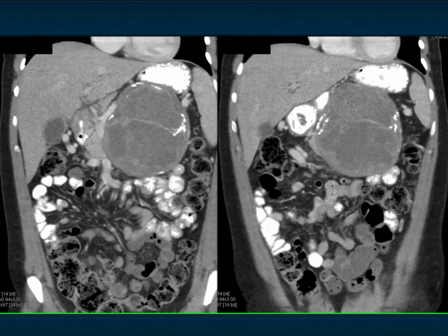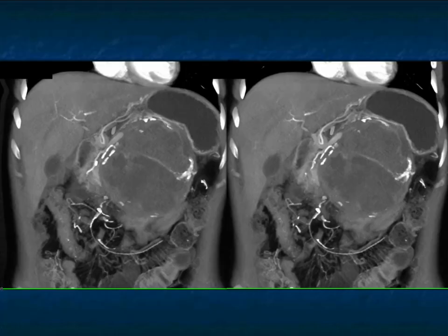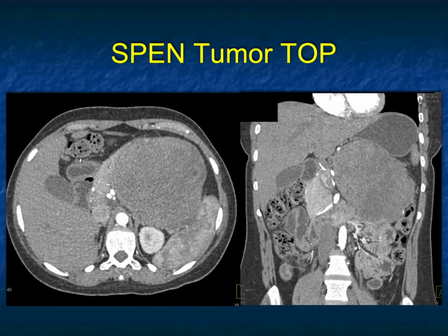So what are you dealing with? It doesn't really look like serous cyst adenoma, doesn't really look like an MCN, but I couldn't exclude that. Neuroendocrine tumors can be cystic with rim-like calcification, though it's usually more vascular, as we showed a few moments ago. So what do you do with this lesion? These are the ones that really drive you crazy. You can give a differential, but you're not really betting on any one thing. You're waiting for the path report. And this was a SPEN as well.